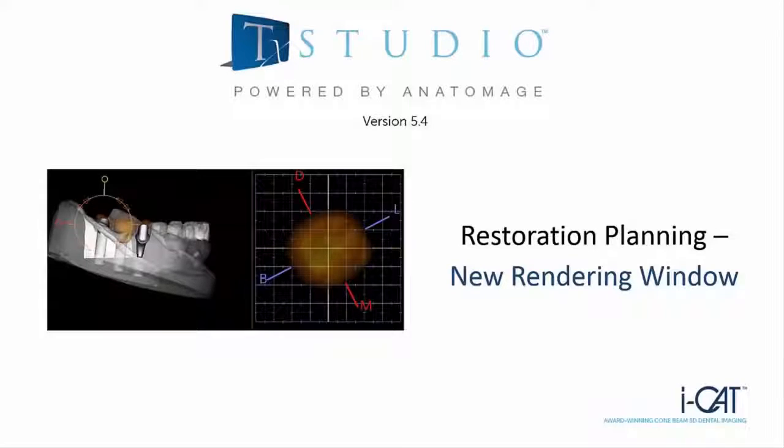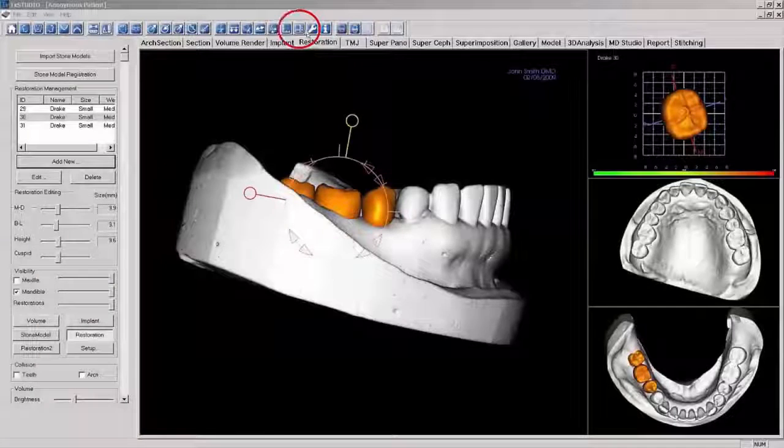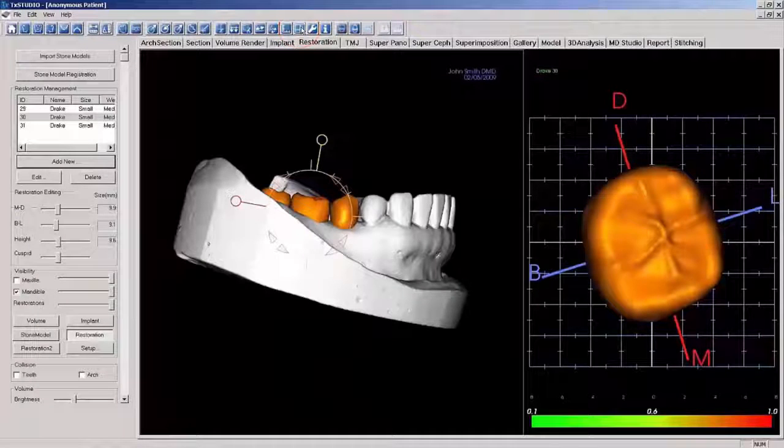New rendering window for crown design. To assist with crown design, TxSTUDIO 5.4 introduces a new rendering window option. You may expand the upper right single tooth rendering window by selecting Change Layout in the toolbar. In the new window, the tooth model may be independently manipulated.